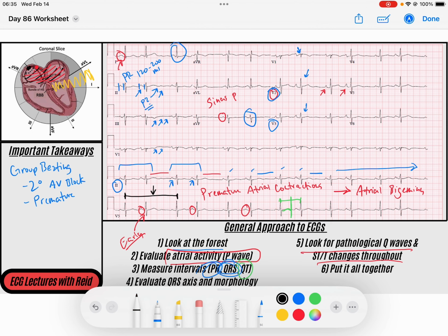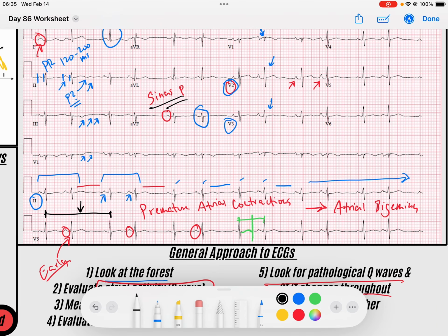So we've got a sinus rhythm. Let's calculate our rate now that we've figured out this is a bigeminal pattern. Since you can't really measure here to here, that wouldn't be the best, you can actually measure from this R to this R, calculate the rate of that and then double it. So let's see, how many little boxes do we have? 5, 10, 15, 20, 25, 30, 35, maybe 39 or so little boxes. So 39 millimeters.